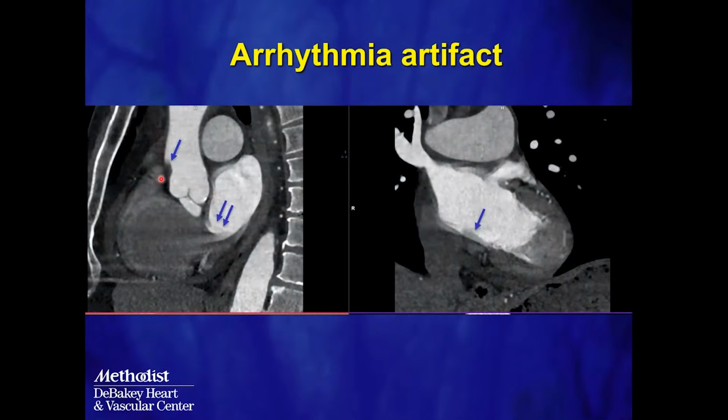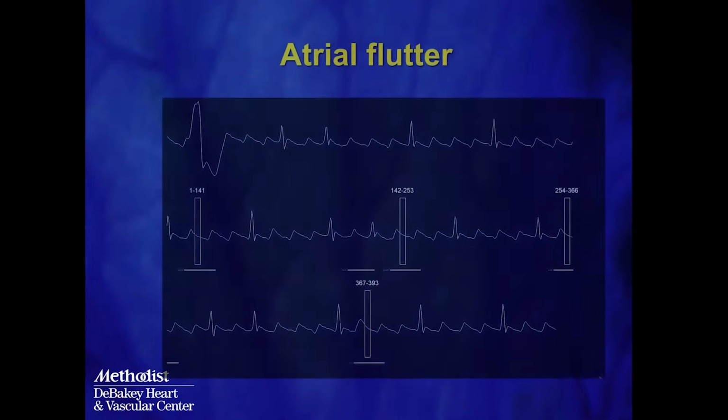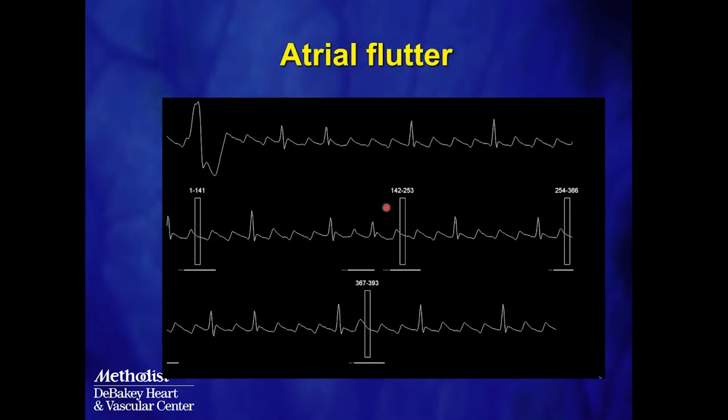On these sagittal images, you have those break lines and shadows occurring over multiple parts of the heart. You can also notice this in the left atrial wall. The reason behind this is that the patient was in atrial flutter, which led to the heart being out of phase from the variable RR interval, so there is constant cardiac motion during our prospective image acquisition in this case.